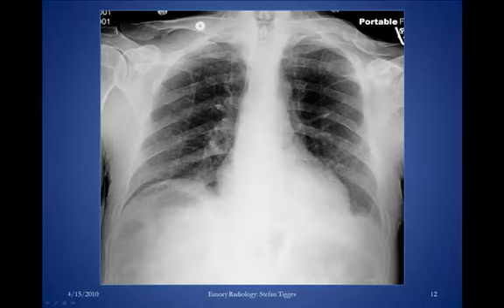We've got air beneath the liver and the right hemidiaphragm, but you can see that this air has structure. It looks like colon. It's got those haustral markings that go partially across the bowel. So this person has colonic interposition. They do not have free intra-abdominal air. So that's one of the pitfalls that we want to avoid.